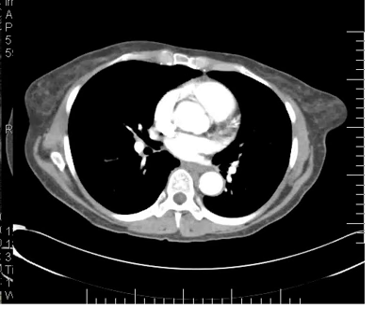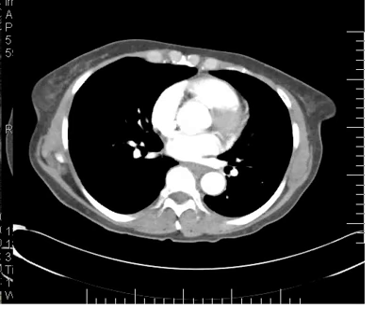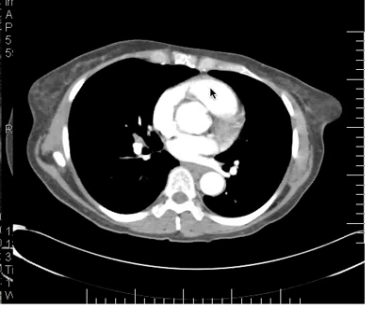And let's see if we can point it out well here. Here's the right ventricle. Remember, right ventricle, right atrium, right ventricle. And now I'm going to move superiorly. And so here it is here. And this is going to dive back. Now this is the ascending aorta.